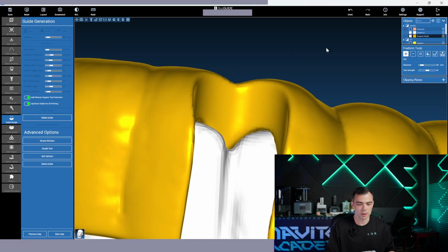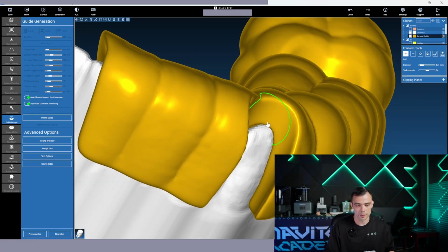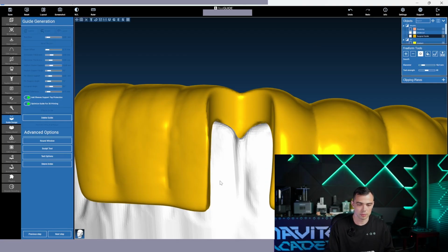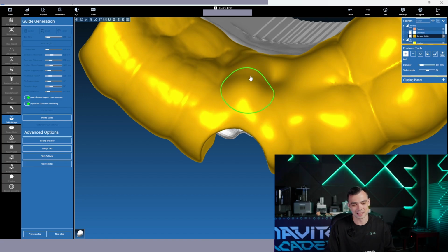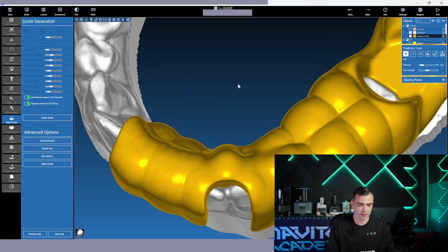Since you see this M shape during the operation, you see the vestibular part, occlusal part, lingual part of the teeth, everything's okay. So you can quickly estimate the fitting of the guide on the teeth, and therefore we love this type of window. Also, if you're a paranoid person, you can add some volume here, not to let the guide break here, but actually you don't need to.